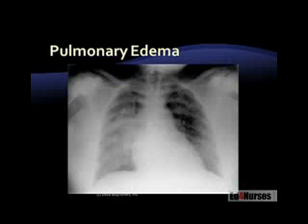Going back through our 5 steps, the first thing we do is assess for lung expansion. Now you see the nice diaphragmatic arch on the left-hand side of your screen, which is the right lung. You see that nice diaphragmatic arch? That's what we should have seen on the previous slide. So here we have a nice diaphragmatic arch.